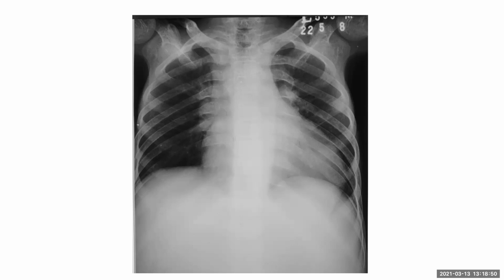And also the retrocardiac region, and I think the left hila looks a bit prominent. So this patient with the... I'm not seeing any obvious findings. I'll see if there are any lateral views available or any previous films for comparison. And I forgot the history. The history was fatigue and weakness. Remember? Yeah, fatigue and weakness.